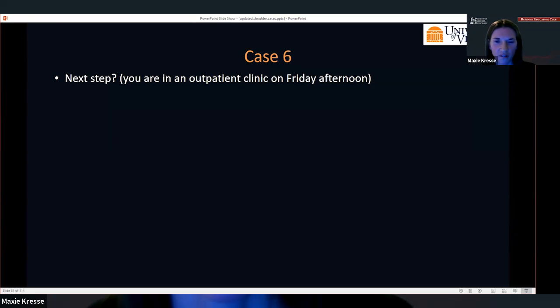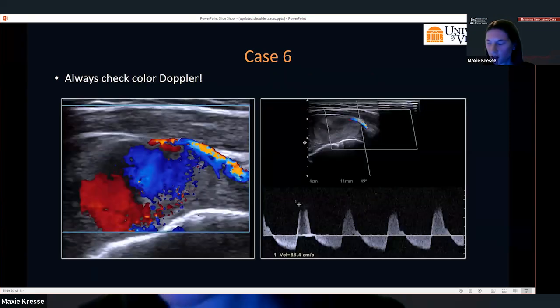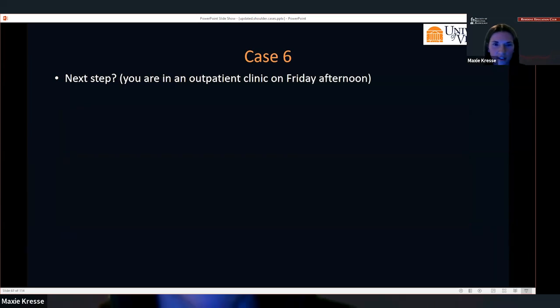So you have this patient in your clinic, and it's Friday afternoon. And you see this on ultrasound. So what are we going to do next? So first, yeah, a couple of people got it here. Number one, we cancel aspiration, right? No aspiration for this patient.